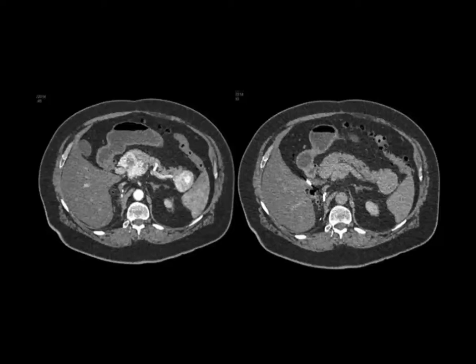If you look really hard at the right renal bed, which you just barely see, there are some clips present, and you do visualize the left but not the right kidney. This patient has had a renal cell carcinoma. Now, if the patient did not have renal cell carcinoma, I would have said multifocal neuroendocrine tumor.